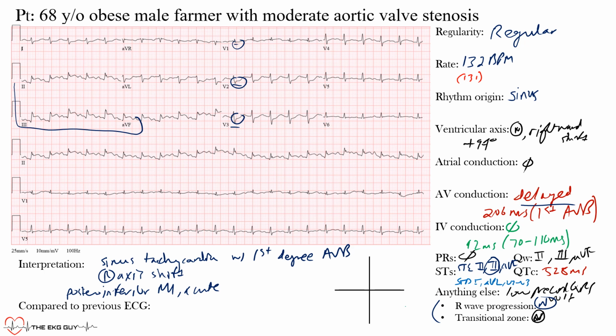Okay, and I'm just looking at this here, that these are likely suggesting that there is actually posterior involvement. Okay, and what I would glean from that is that we likely have an RCA infarct, okay, that's extending to the posterior descending artery, okay, as a result, because in this patient it may actually be right coronary or right-sided dominant. Okay, so as you can see, I'm trying to predict where the interventional cardiologist may intervene, and so it's likely right-sided involvement.